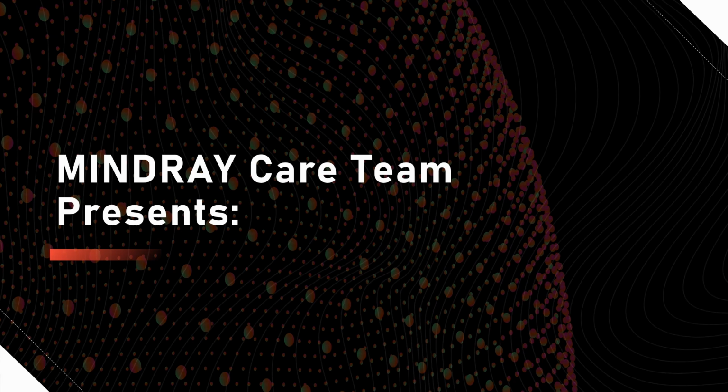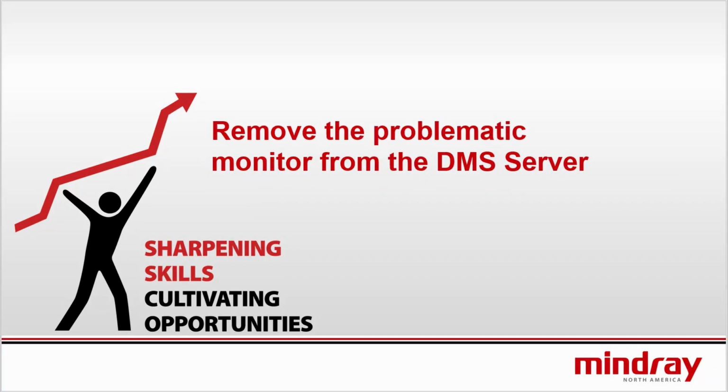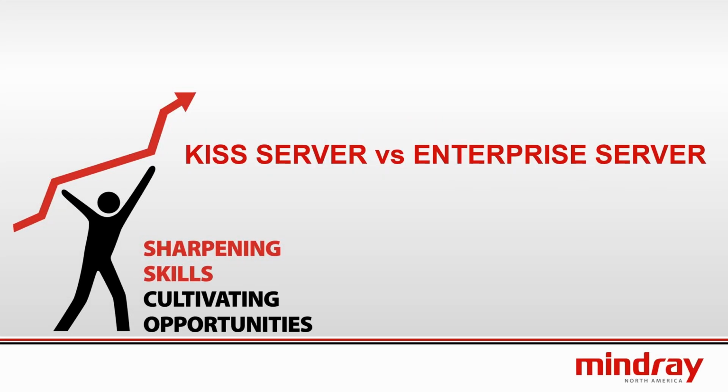Mindray Care Team presents instructions for replacing a BeneVision N22, N19, N17, N15, or N12 monitor from the DMS server. The problematic monitor must first be removed from the DMS server. First, identify if the DMS server is a KISS server or an enterprise server.